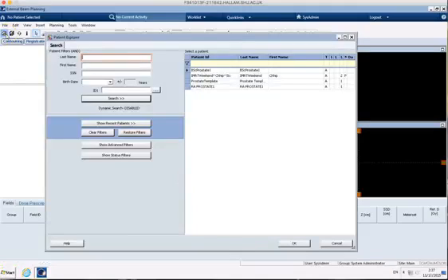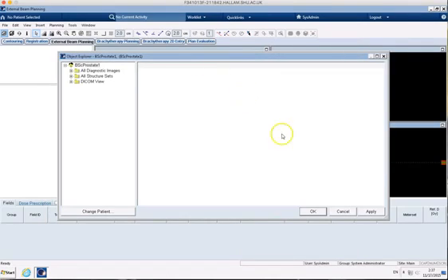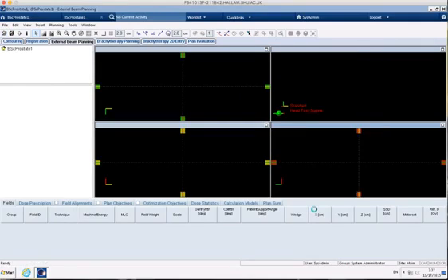So if we open up there, my patient is called BSC Prostate 1. Now you can see I've opened it recently, so that's on my list of recent ones. When you open it after the first time, it should be on your list. But if you need to search for it, you can just start typing in BSC, and it will come up with your patient there. So we're going to click OK to that. And so that brings up our patient, which we can see here.